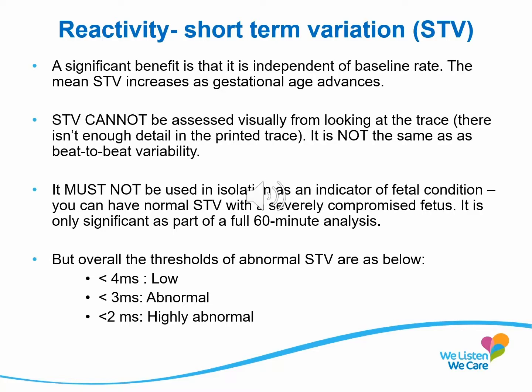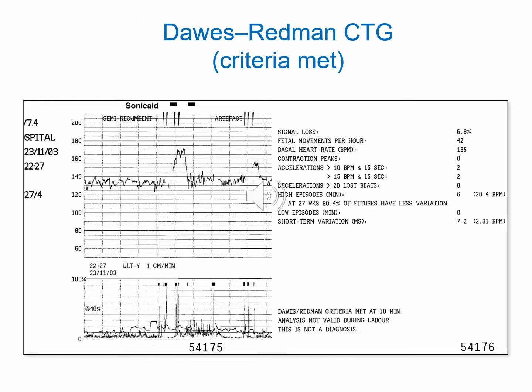So, summarizing, this is a trace that demonstrates how the Redman CTG appears on the printout.